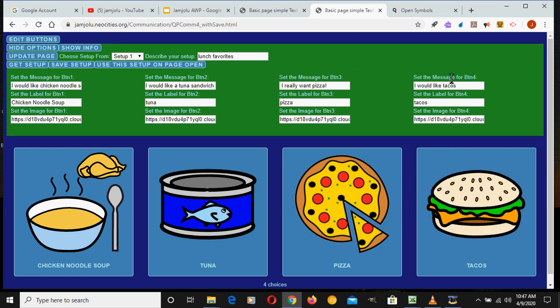But let's change now the message. A cheeseburger, and cheeseburger. Okay, so let's update the page again, and let's listen to it. I would like a cheeseburger. Okay, so that's great. They would like a cheeseburger.